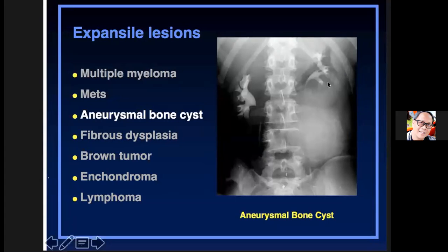Your clue here is a very large soft tissue mass. Look at the soft tissue mass. Is there any abnormality in the adjacent bony structures? Yes or no? Yes, doc, in the vertebrae. Where is the abnormality? Where is the lytic change? Vertebrae, lumbar vertebrae. Which level? L4. Yes, 1, 2, 3, L4.